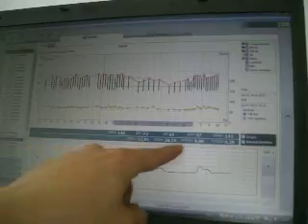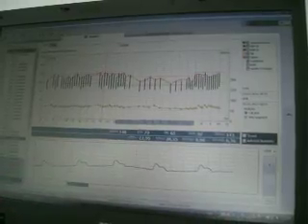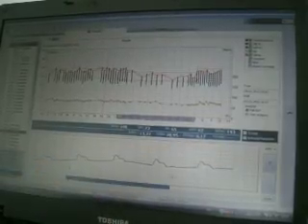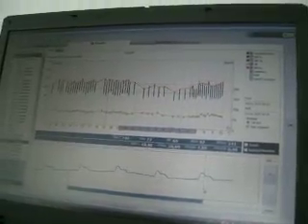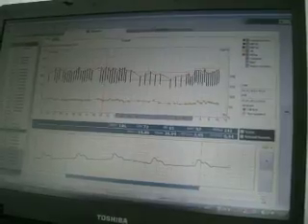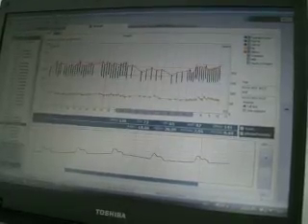If you don't like the automatically calculated results here, which is actually the average of this whole segment, you can highlight only one, and you can see that the numbers here changed, or a series of waves and receive a bit different results. If you like it more than the whole, just press save here, and your manually chosen numbers will be saved into the database for later evaluation.